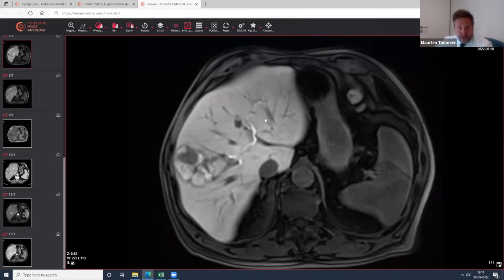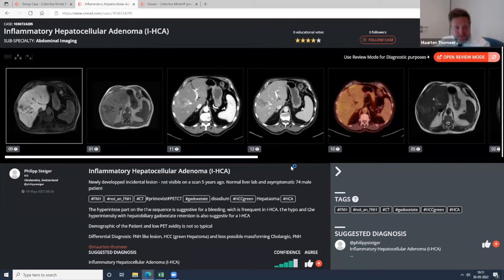Do you agree, Johan? Completely, Maarten. Do you agree? Yes, completely. So I don't think this is an inflammatory hepatocellular adenoma, but HCC. And maybe we can also recommend, if you didn't watch the previous sessions on adenoma, which was very extensive and in depth on that topic, I recommend you all watch that, which is also available in the Liver MRI group on Collective Minds, the course lecture of you, Maarten.